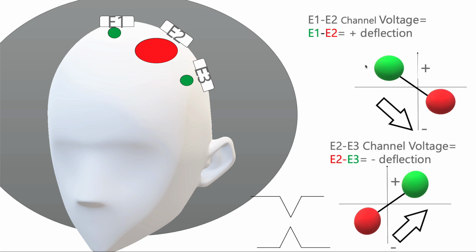So this Cartesian system here creates a waveform that looks like this, and this one here creates a waveform that looks like this. And so overall, this discharge has a negative polarity, and you see a negative phase reversal here. You could slide a negative symbol right in between these two.